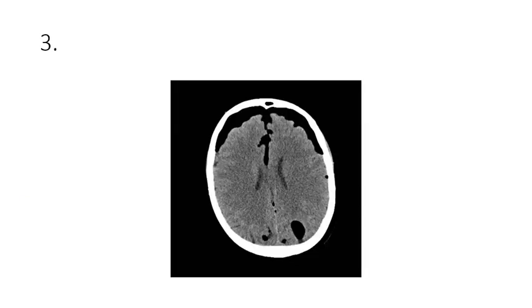All right, now remember what we talked about hypodense. Hypodense can mean either you are looking at CSF, which is fluid, or you are looking at air. You are seeing this black is the same black as this. This cannot be CSF. This is too hypodense. So you are seeing a very hypodense area bilaterally, particularly more in the frontal aspect of the brain. However, we are also seeing a patch of area in the occipital area of the brain. So when you have this black, you are looking at air, and we call it pneumocephalus.